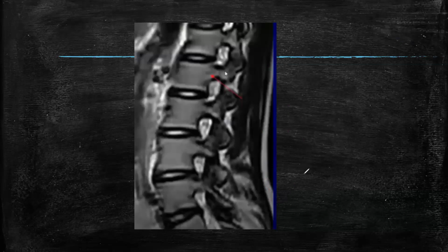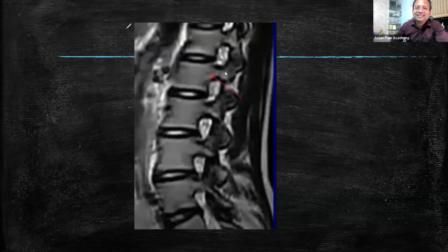I think it's T2 because you have the disc, there's whitish, and the transforaminal, where you have the fat tissue, is white as well. Yes. See, this area is fat. This is a foraminal area. So these are small roots and around that all fat. So you can see fat is white. Now you have to find some water because you cannot see the CSF here. You see this part. These are nucleus pulposus and water is there. So water is also white. Okay.